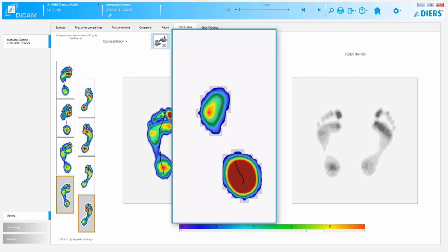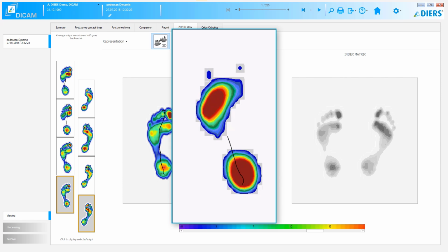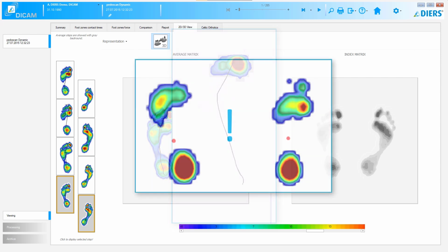The high-arched foot, on the other hand, maintains a regular COP course. Over the missing pressure pattern of the midfoot, the COP continues in the direction of the third metatarsal without a visible bend toward the medial side. The pressure development on the forefoot also runs regularly from lateral to medial. A distinction should be possible without further ado, taking into account the points mentioned above.